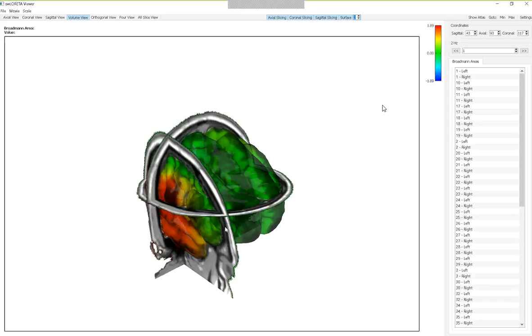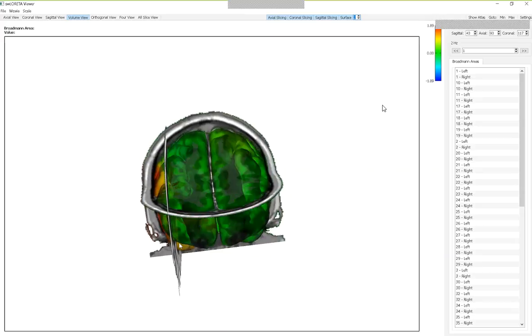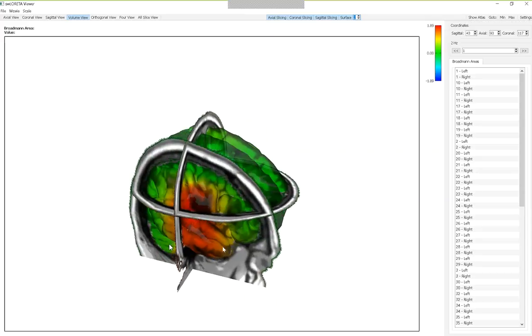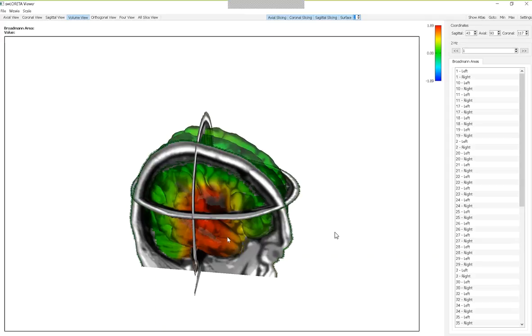The important aspect of this is that all slices, as well as the orthonormal or orthogonal views, are available by just a single mouse click. And you can also go through the volume by moving these scales or markers, the horizontal, sagittal, and coronal planes, through the volume, and see which Brodmann areas are most deviant from normal. You can also find the minimum and the max.